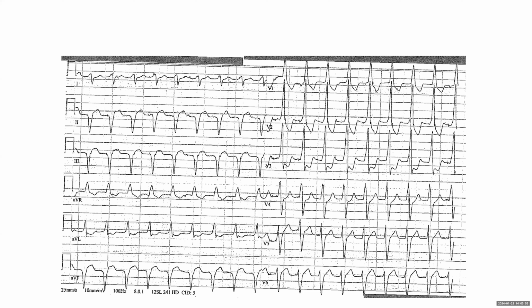Good. And then we said you can write sinus because the atrium is in sinus rhythm. So sinoatrial rhythm, the code doesn't have that specifically, but when you write VT and sinus, it should be obvious that you're talking about the atrial rhythm. Good. Any questions about this one? No? Okay. Next ECG.